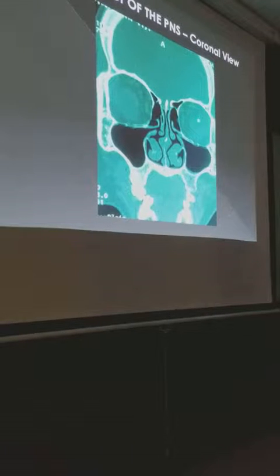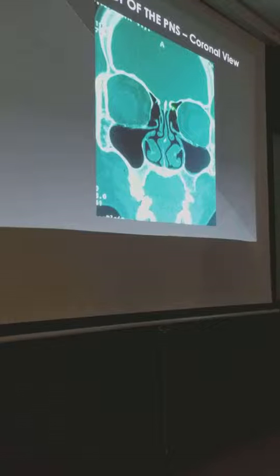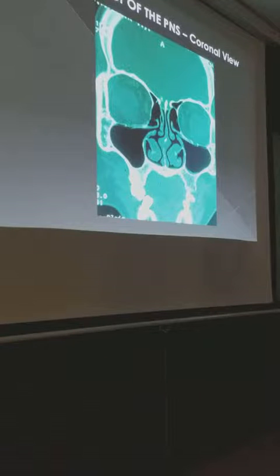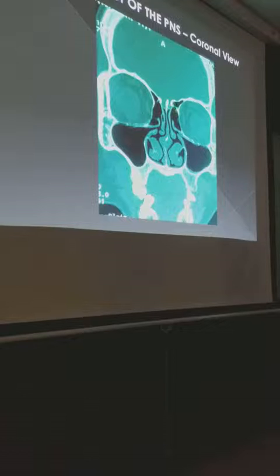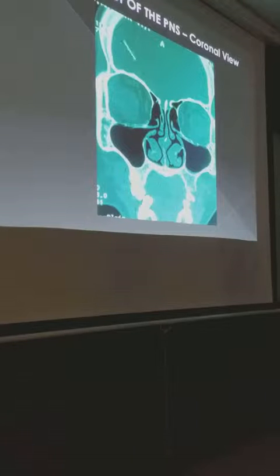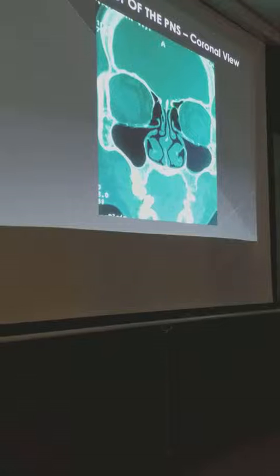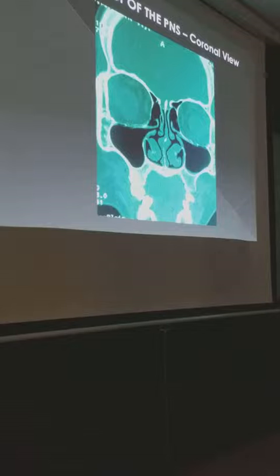So if you notice here, the anterior ethmoidal artery starts from the orbitocranial canal, or from the orbit, and then it passes the orbitocranial canal and enters at the junction of which one? The fovea and the lateral lamella. That's why, as we said, that is the weakest point in the entire skull base. The weakest point is the junction of the thick fovea and the lateral lamella. For what reason?